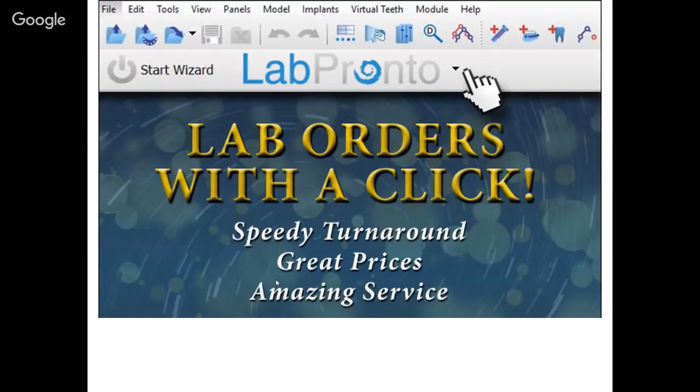Right now in the software, as we're going to see, we have different products and services that can be ordered, including treatment planning, surgical guide printing, ortho planning, and ordering physical aligners or models. All of that is in the built-in order form in the Blue Sky Plan software. We'll take a look at that, and you can order all of that directly from the software.